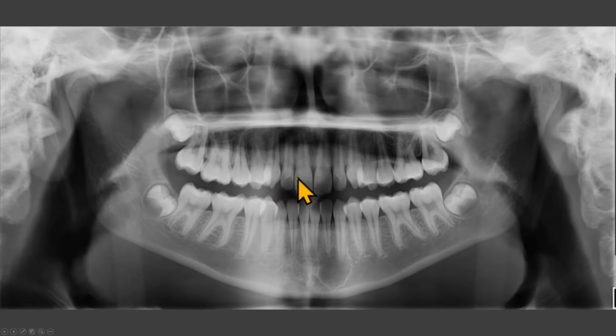So this is good. The right and the left teeth should be similar in size, which is also good in this radiograph. The right and the left ramus should also be similar in size. The hard palate should be almost horizontal, similar to this radiograph. The posterior border of the ramus should be inclined towards the back of the image. The hyoid should not superimpose over the body of the mandible. The dorsum of the tongue should be in contact with the hard palate.